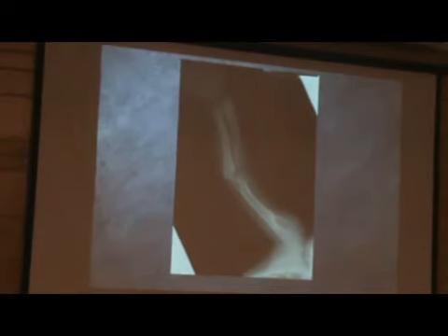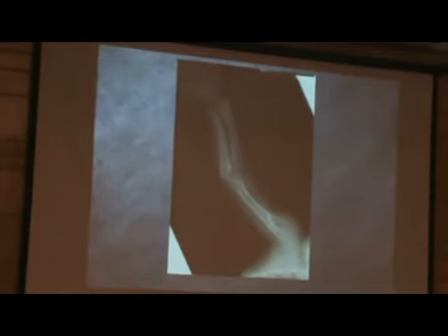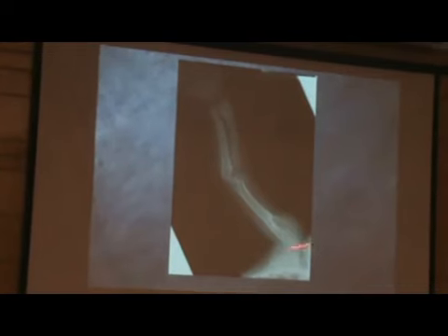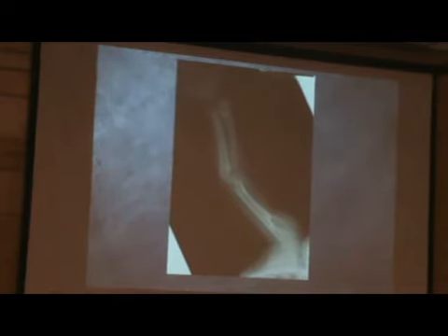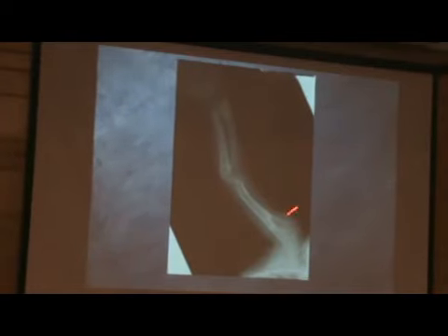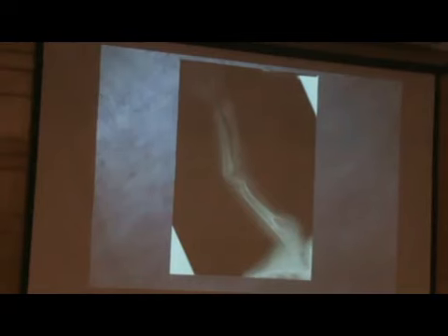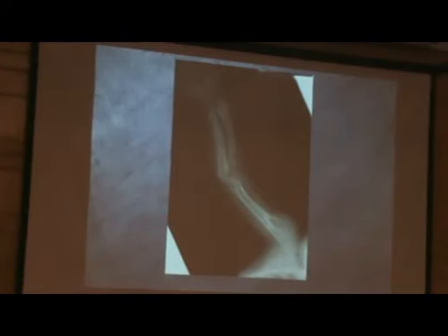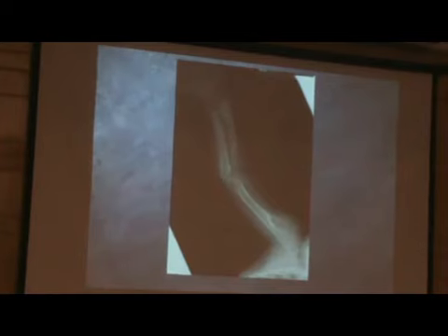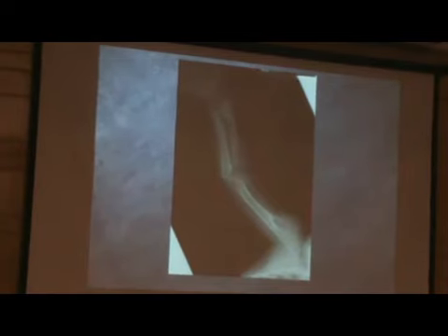When you're dealing with Ollier's disease, the lesions you see are going to be different than solitary chondromas, and some of them are periosteal chondromas, and some of them look pretty aggressive, and individually those lesions would look almost malignant, but in the context of Ollier's disease, it's quite normal. The progression of the lesion is probably the most important thing for those patients to consider malignancy.